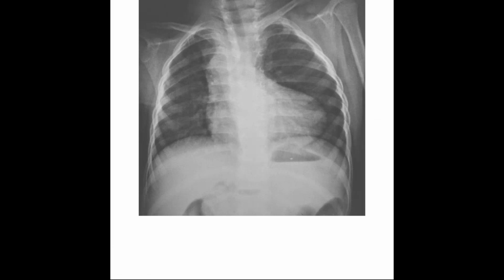Okay, so we come to this. Now tell me. Yes, it is tetralogy of Fallot. First of all, if you would have noticed, this is an AP view. Why is it an AP view? Yes, very good, Nilayan, because you see the medial border of the scapula is here.